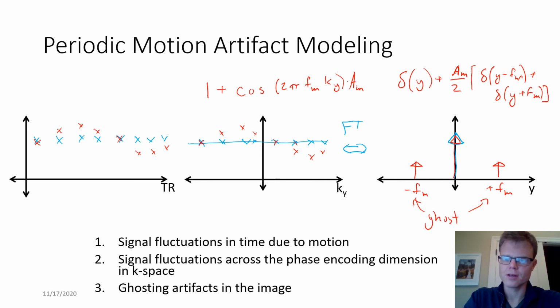And these are going to be our ghosts. And so they're coming from a single source. They have these very distinct locations. If we knew, for example, our k-space coordinates and the time, the TR it takes, we could actually calculate what these specific locations are where we would expect these ghosts to appear.